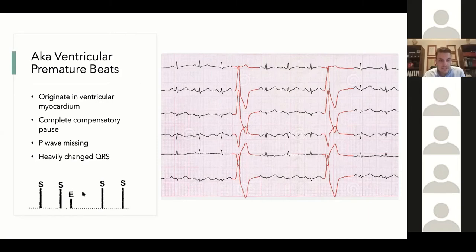And you can see it right here that the time in between the extrasystole and the next beat is equal to the time that is taken from a normal beat towards the next. Do we all remember that? Do we remember how the compensatory pause works? I guess so. It is present in the lecture, and we can go through it if you'd like.